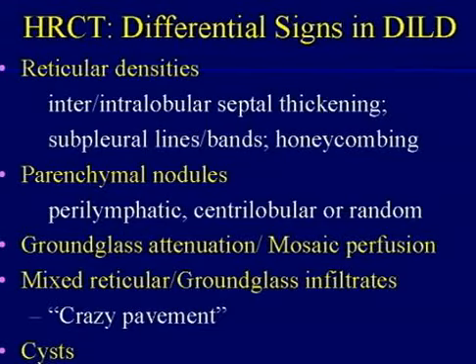And if you're going to follow patients, as we now do, I have scans now where I have 10, 11 follow-up CT chests. The pulmonologists are looking at CT like their chest radiographs. That's a huge amount of radiation. And the truth of the matter is, for most of the things I'm going to show you right now, it's absolutely not necessary. You can get away with cutting the dosage by 1/10 and still have perfectly interpretable images. So just by way of a little bit about technique.